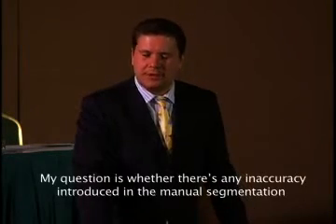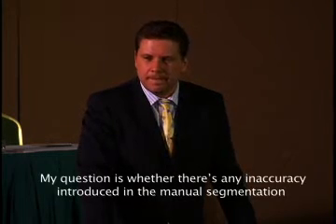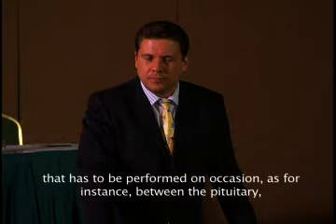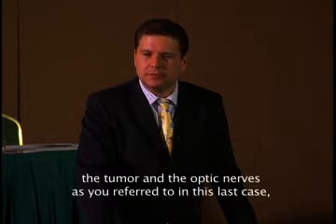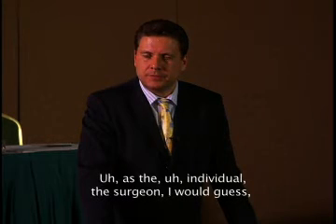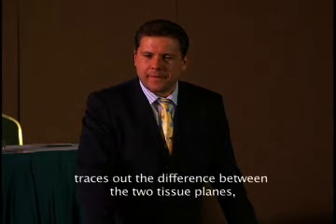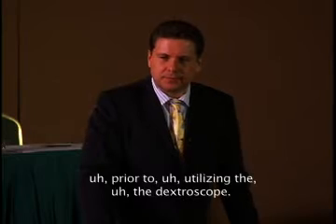My question is whether there's any inaccuracy introduced in the manual segmentation that has to be performed on occasion, as for instance between the pituitary, the tumor, and the optic nerves, as you referred to in this last case, and if so, whether that really makes any difference clinically, as the individual, the surgeon, I would guess, traces out the difference between the two tissue planes prior to utilizing the dextroscope.